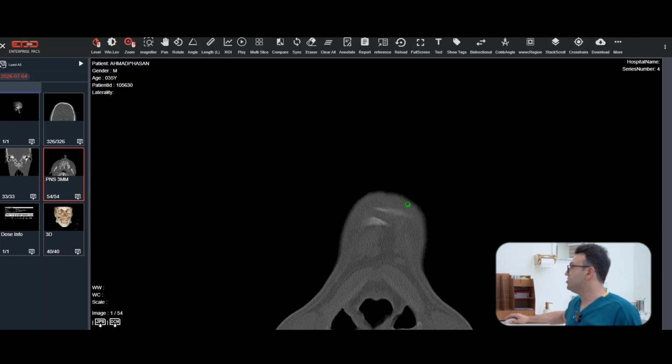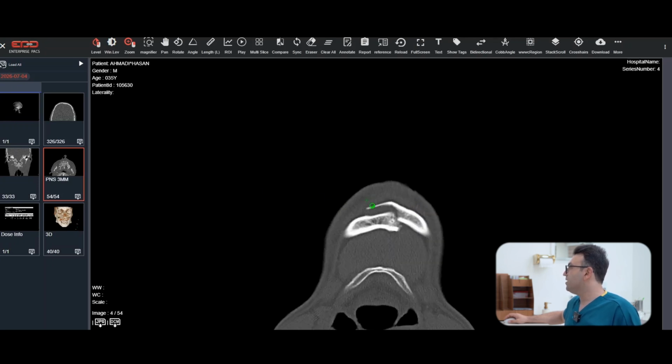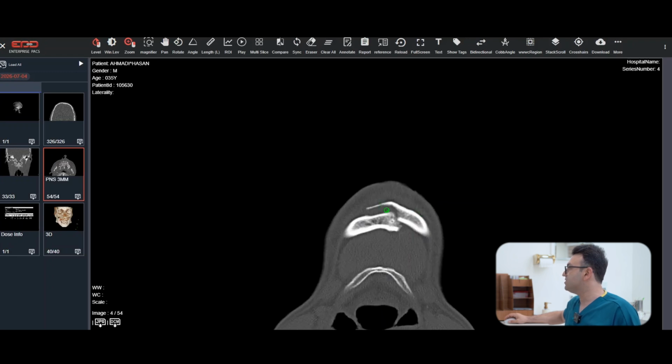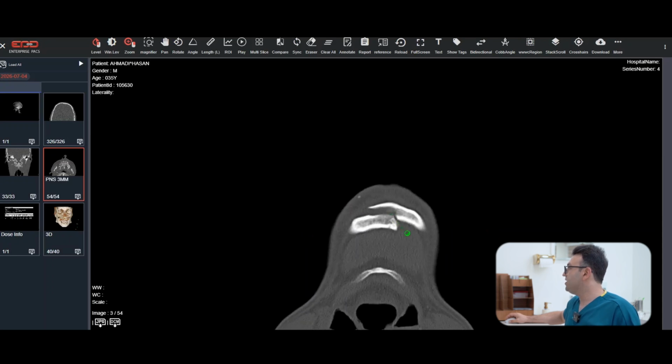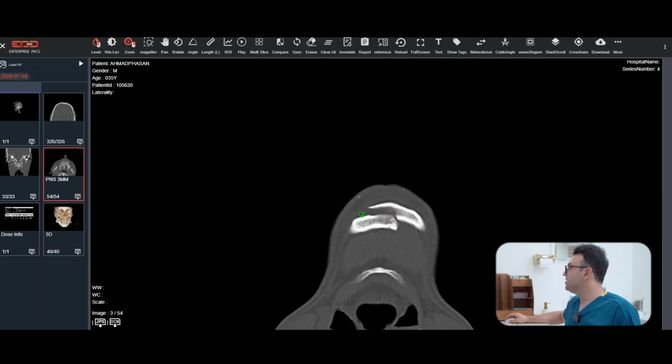It means that I first check the symphysis of the mandible and the body of both sides of the mandible. Okay, in this case, I see a very large displaced fracture there. We can see that it starts from here at the symphysis on the left side to the right. It is in an oblique direction.